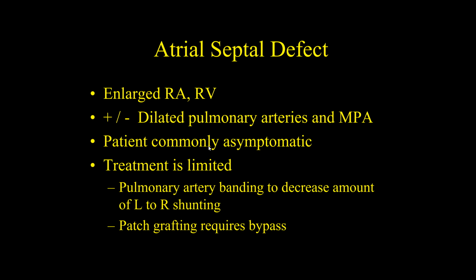They show no clinical signs at all, and you wouldn't even know they had it unless you listened to their heart, and they might have a really mild murmur. And there's no fix for them anyway. Most of these ASDs, you have a totally normal dog, and radiographically the heart looks totally normal, but they have a murmur. Okay, and you can diagnose it with an echocardiogram with ultrasound.